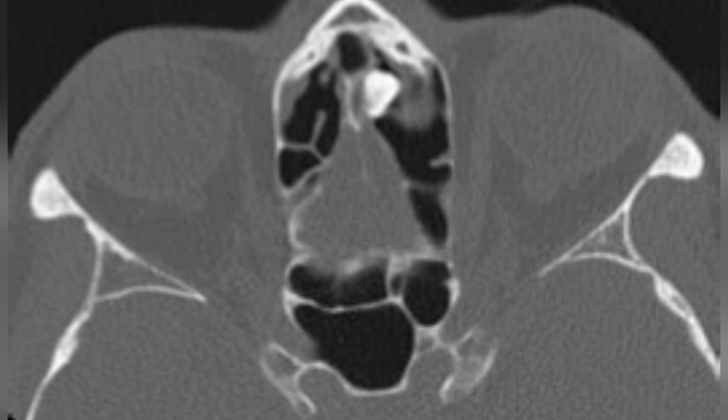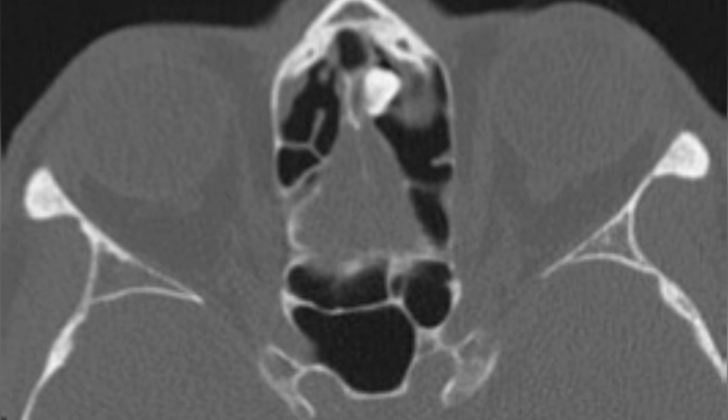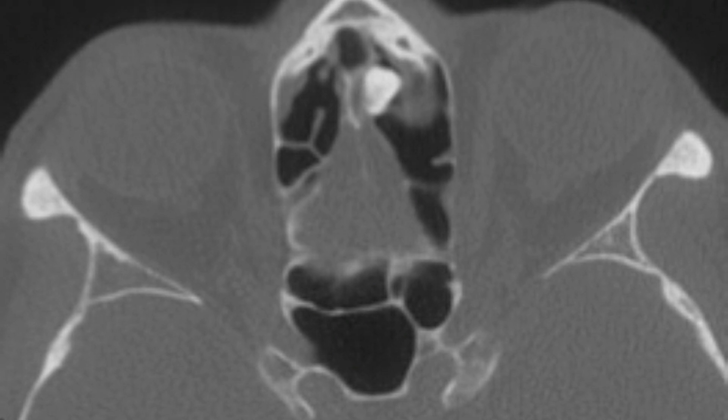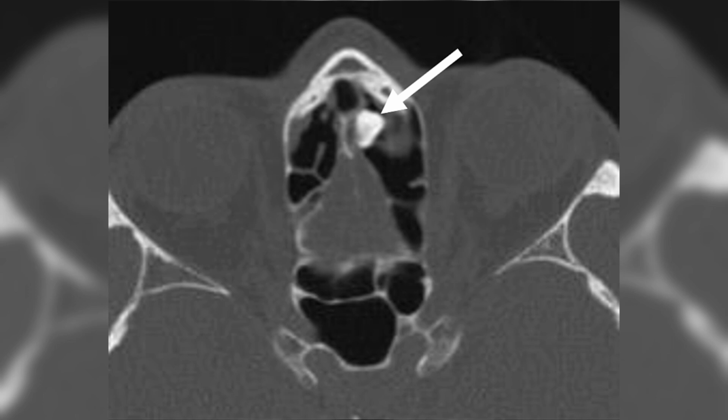The patient is a 66-year-old male presenting with nasal congestion. A non-contrast enhanced CT scan of the paranasal sinuses was performed to investigate the symptoms. In the axial bone window CT images, a lobulated lesion is observed in the left anterior ethmoidal cells. The lesion has well-defined margins and is isodense with the cortical bone. These features are consistent with the diagnosis of an osteoma.